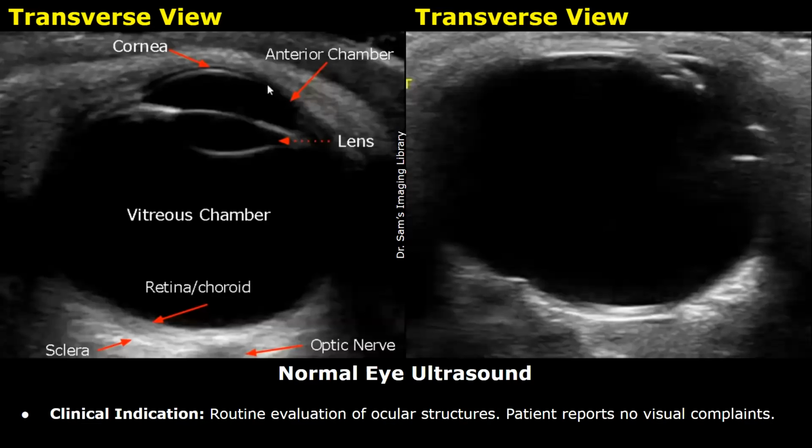This is the clinical indication in this example. Routine evaluation of ocular structures. Patient reports no visual complaints.